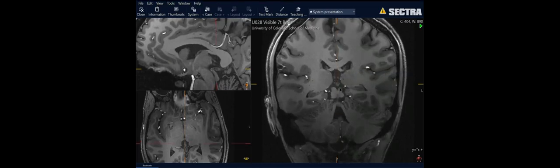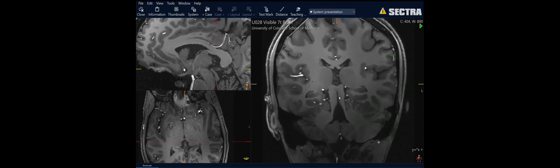It's quite difficult. All right, so at this point, these four lumps that we can see on the posterior aspect of the midbrain are the colliculi, superior and inferior colliculi. And the structure here is the superior cerebellar peduncle, which is going to be that output, working superiorly.